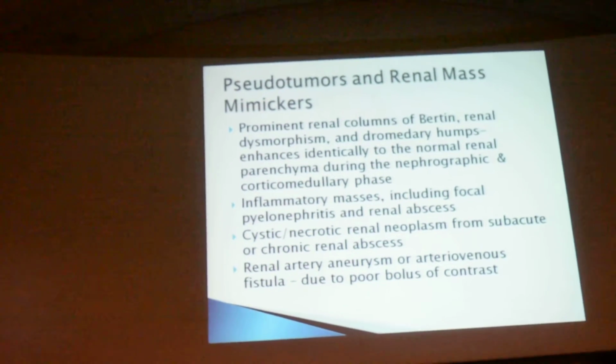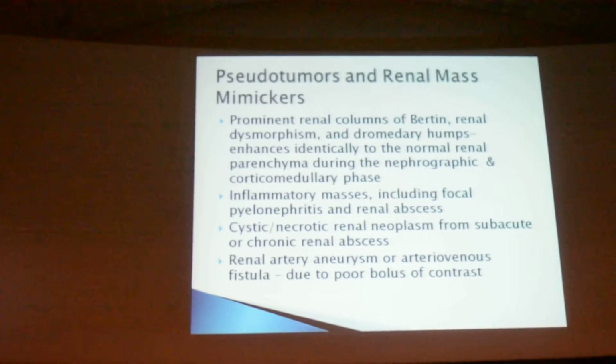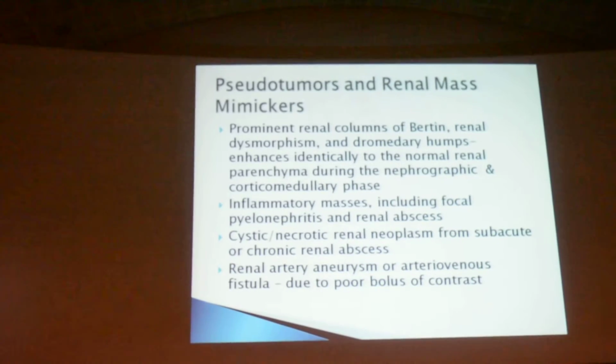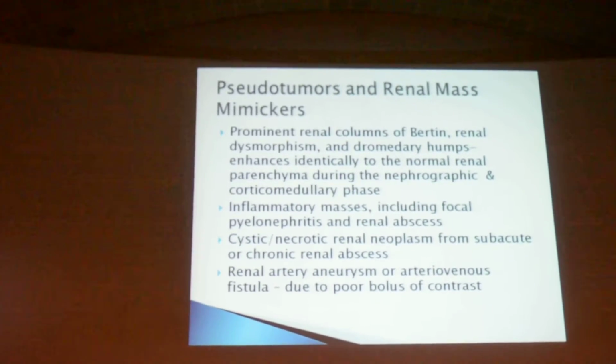And as I said, there are some pseudotumors and renal mass mimics. They can be differentiated based on the CT and MRI, as they show similar enhancement as the rest of the renal cortex.